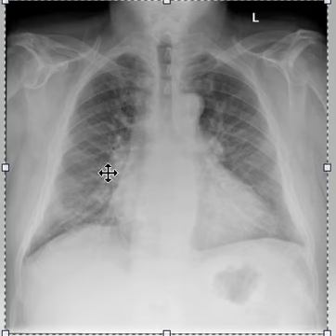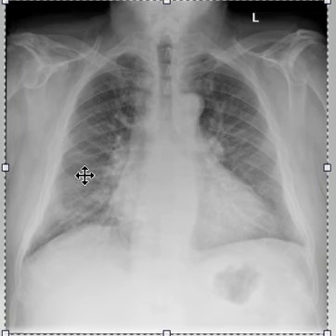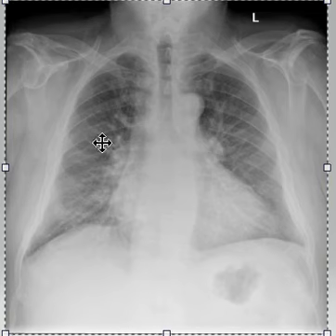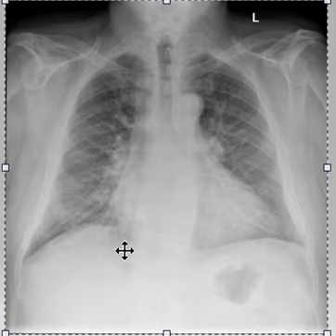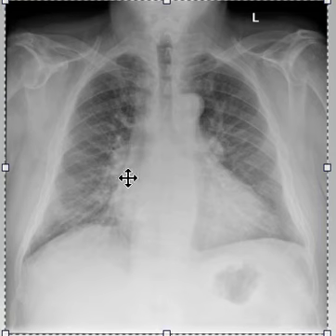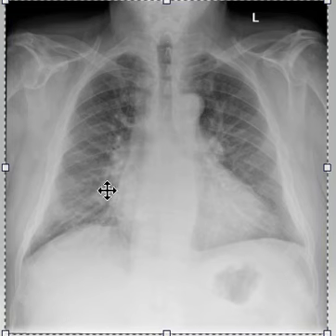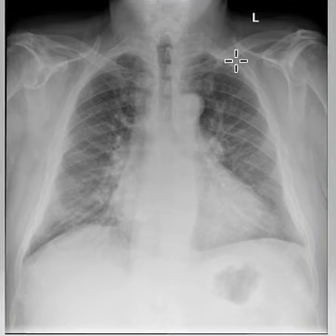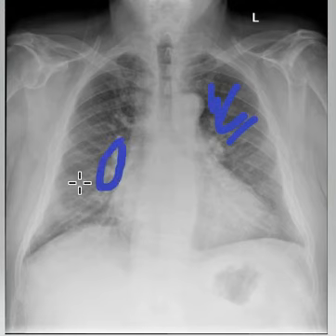These are the hilar vessels, and you can see that due to congestion they've become very prominent. And you can see these vessels up here as well, which is known as cephalization. You can't quite distinguish between these vessels that well as you could in the normal X-ray. So there's this haze, this hilar haze as well. So here's the cephalization, you can see these vessels which are here. You can see this hilar haze over here.